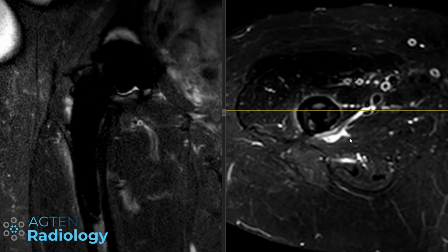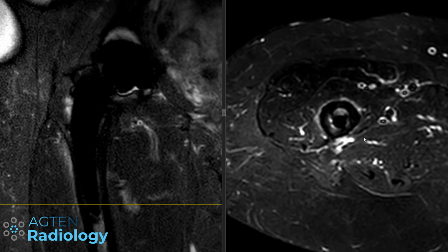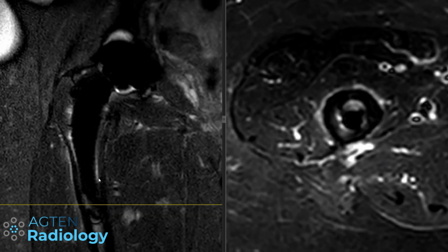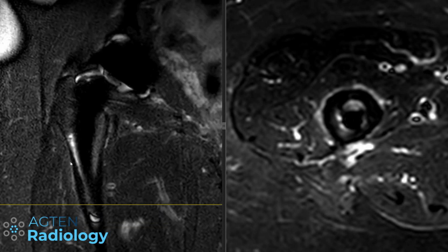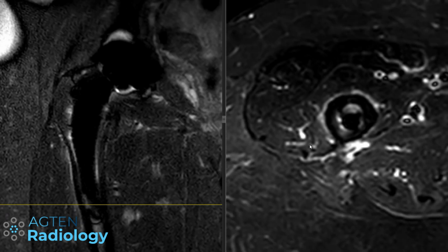want to show you here today is a very subtle finding that you should specifically look out for, because otherwise you will miss it. And what I mean is basically a periosteal reaction around the femur as a sign for a bony stress reaction at that location, even if you don't have a fissure or a periprosthetic fracture.